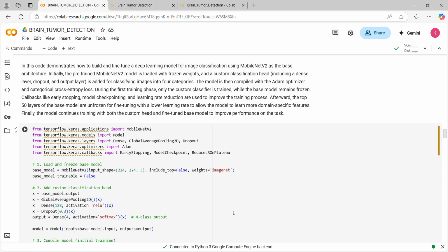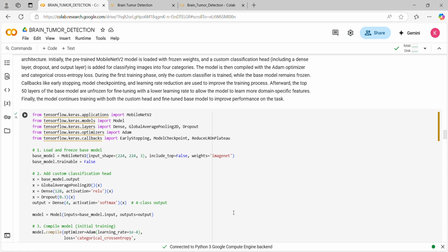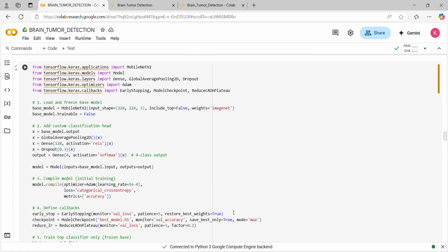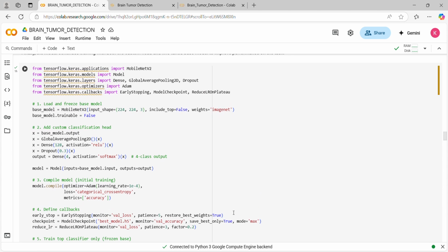I compared different models such as CNN, but comparing these, I prefer this one. It is better, and it's a pre-trained CNN model. So I used fine tuning for this, so it can be more accurate and give more precise values.